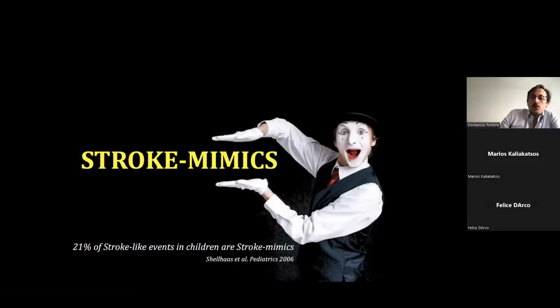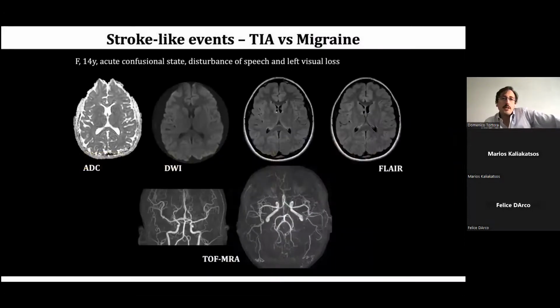Of course, we should be aware that there are many stroke mimics, which represent more than 20% of cases of children with acute neurologic symptoms. And I will show you some cases. This is a case of a 14-year-old girl presenting at the emergency room with acute confusional state, disturbance of speech, and left visual loss.